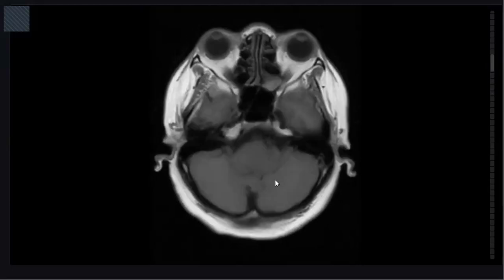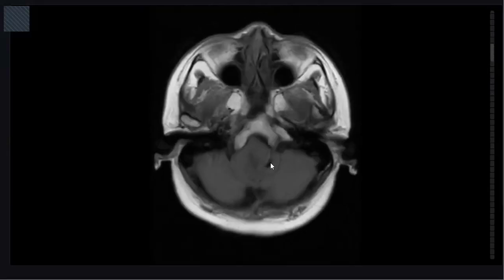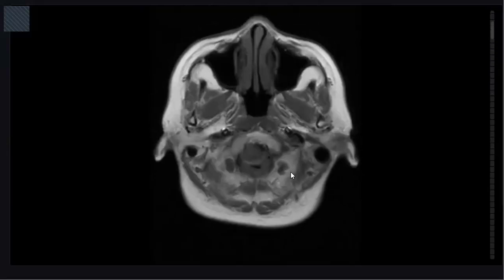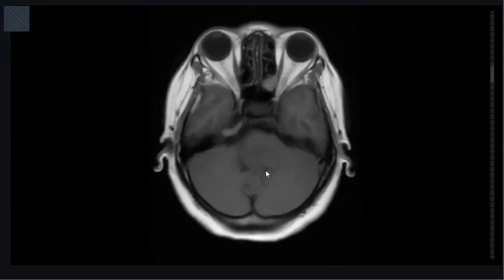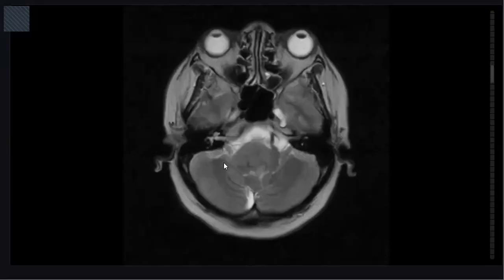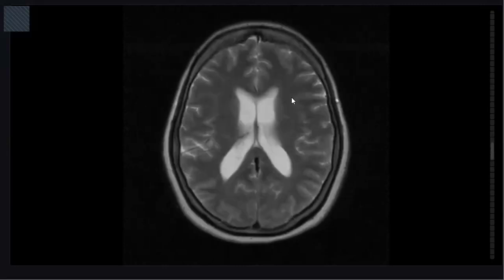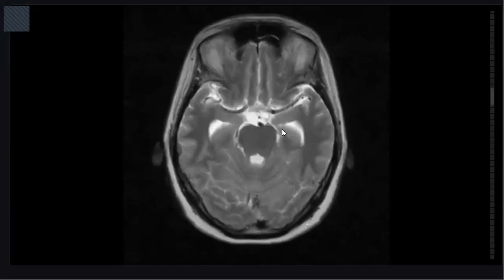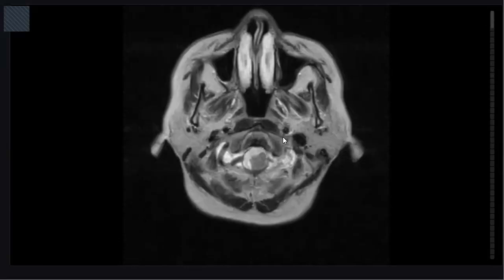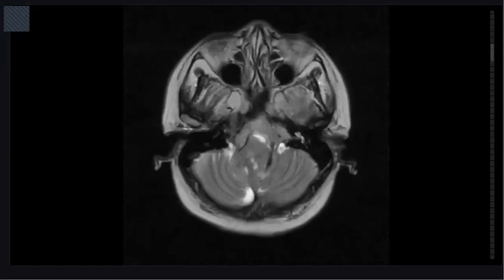We found an iso-intense soft tissue mass here. It's compressing also the left vertebral artery and basilar artery to the left side. So you can ask for T2. T2 shows there is some CSF permeation, which is an emergency for shunting, and it also demonstrates the lesion to delineate well, as you told.